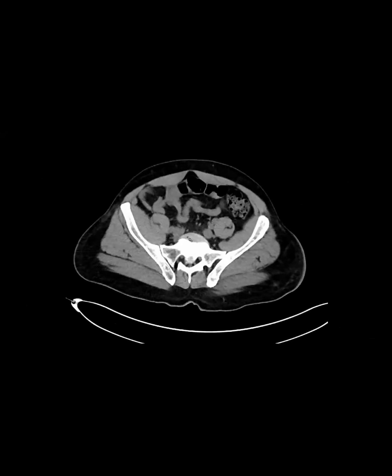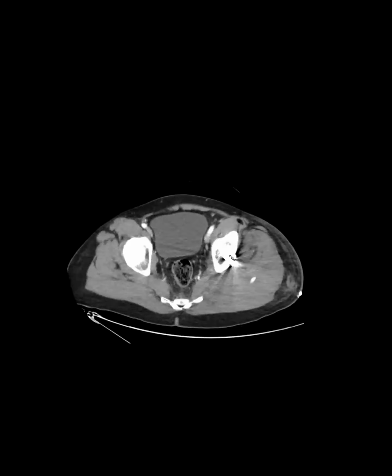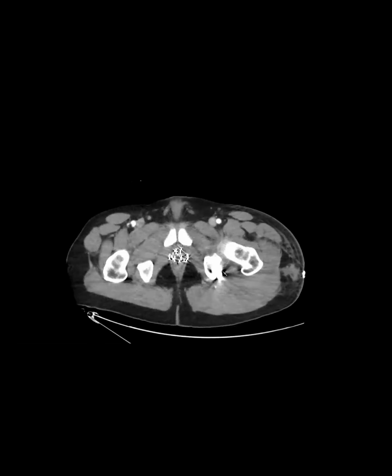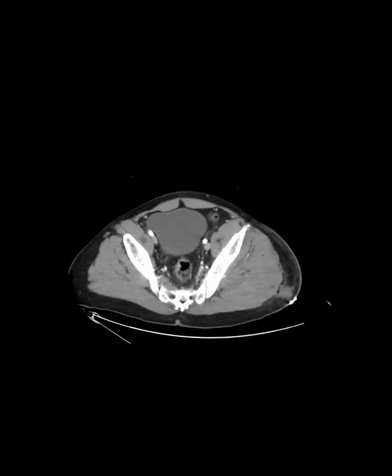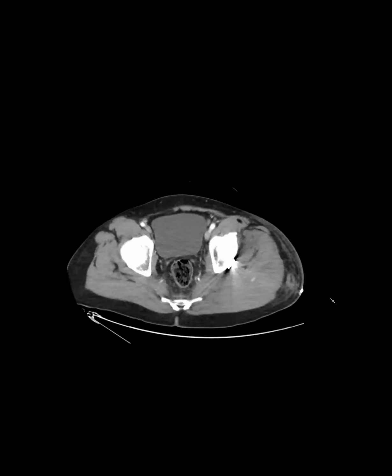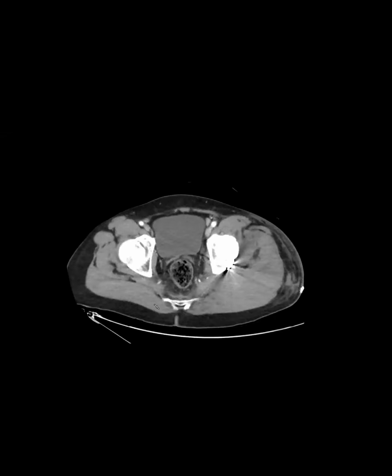Okay, I think this might be my last case. So this patient had trauma and surgery, an acetabular fixation. Any findings, thoughts? Intramuscular hematoma. Yes, good. So expansion of the left gluteal muscles compared to the right. So always look at the muscles. Anything else? Is that focus hemorrhage, or is that a bone fragment? Extravasation or something? Yeah, good.